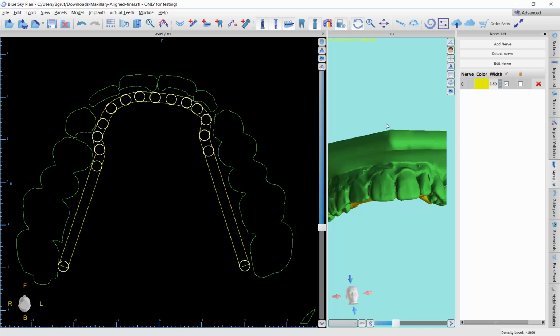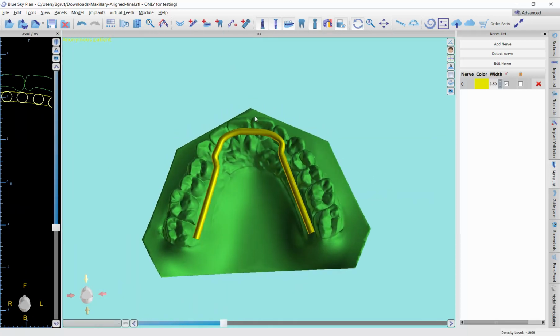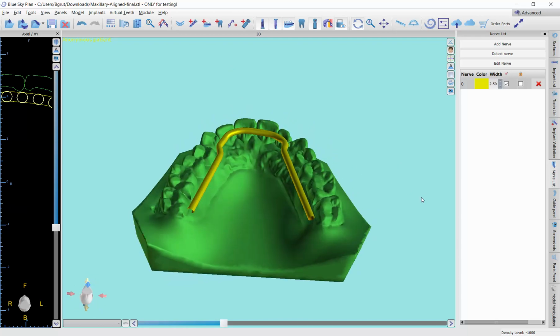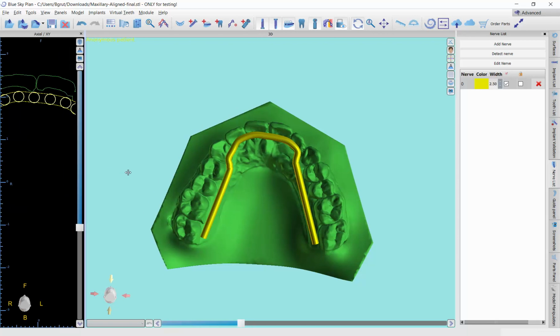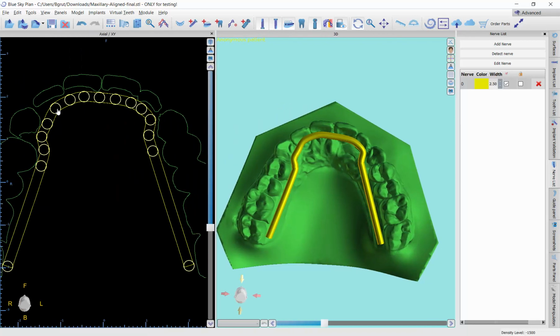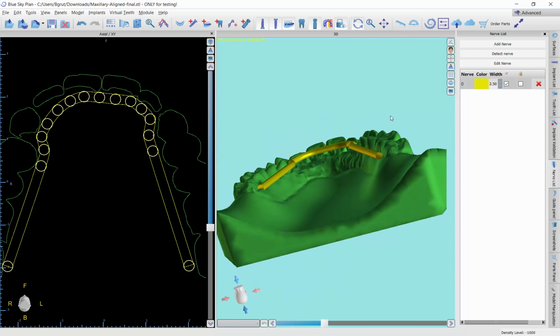So anyway, now I'm not going to close this window. I'm just going to minimize it over here. You can see that here is our customized curve. And if you find that you don't like the way it's shaped, and you want it bent more uniformly, then do what you want to do. You can see the shape changes that are being created as I move things around. I'll leave that up to you, the viewer, to see if it's of interest.